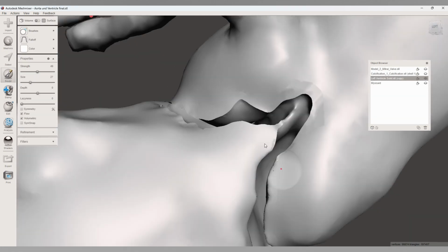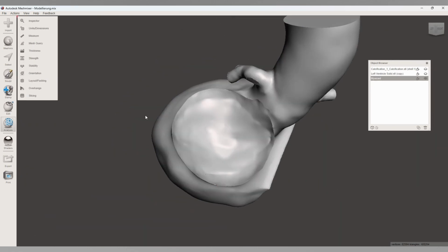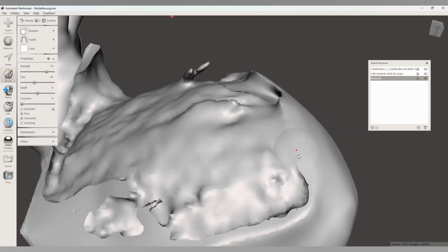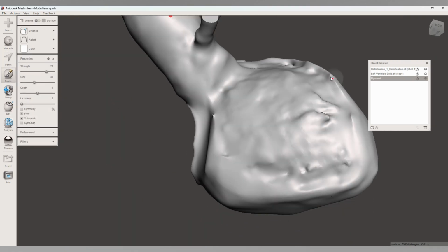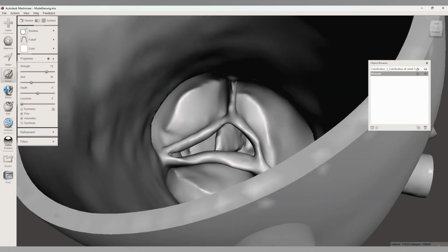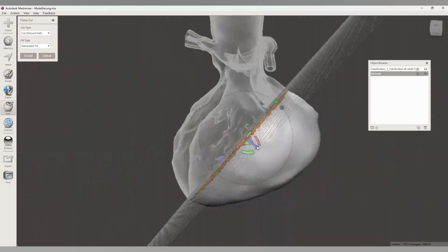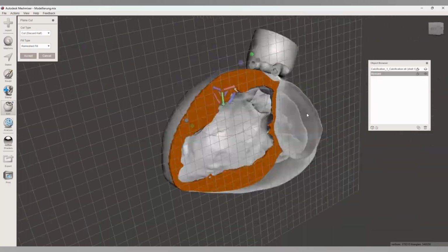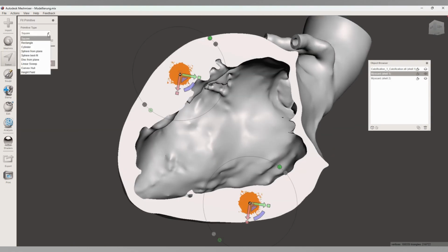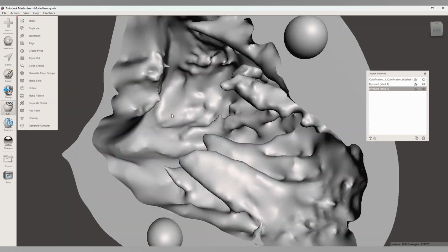Additionally, the final digital model is tailored to meet the specific requirements outlined by the surgeons. It provides a one-to-one representation of the left heart structures, including the left ventricle, mitral valve, aortic root, and ascending aorta. The model's modular design enables direct access to the left ventricle. This feature ensures the aortic valve can be viewed and evaluated from within the ventricle, meeting the physician's need for a detailed, hands-on approach to test and practice the procedure.